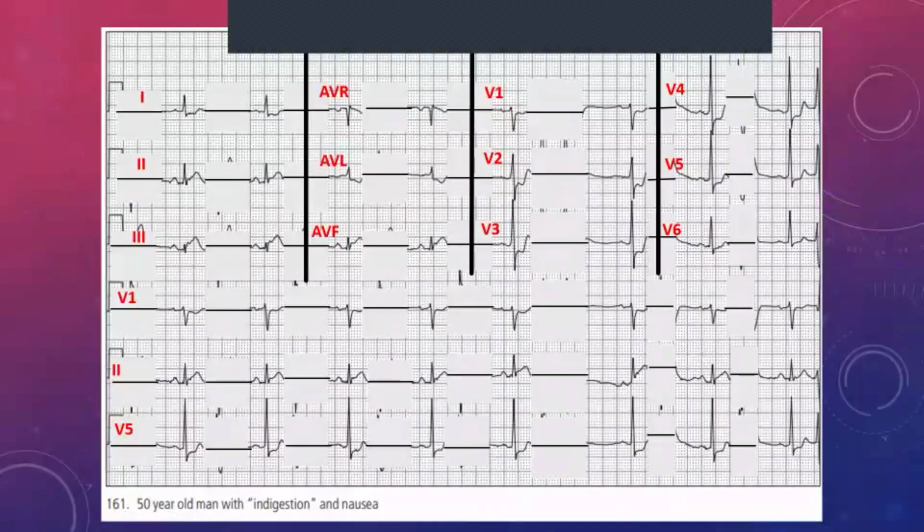Right now, I know it's not a work of art, but it's the closest I could get. So I know things are not 100% aligned, but I hope you understand what I was trying to get at. In other words, we're trying to imagine this ECG without the things that we don't understand, which for most of us would be those large, wide QRS complexes that are just popping up out of nowhere and make everything seem scary.